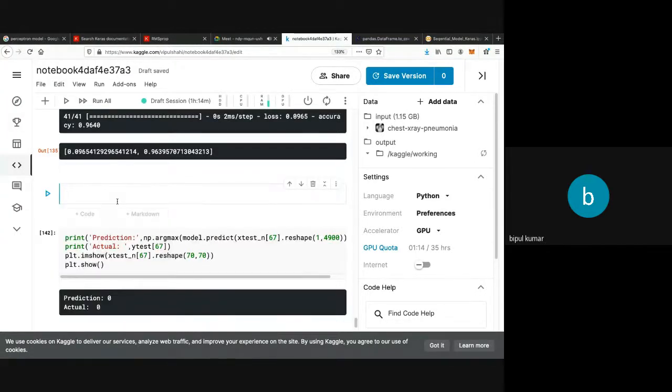The array can represent the chest predicted label.